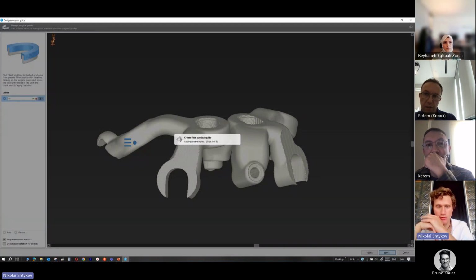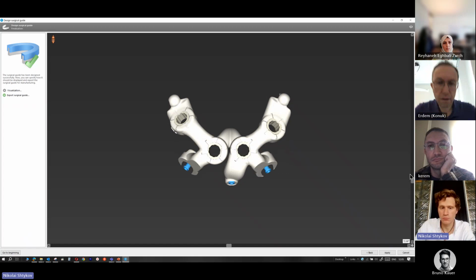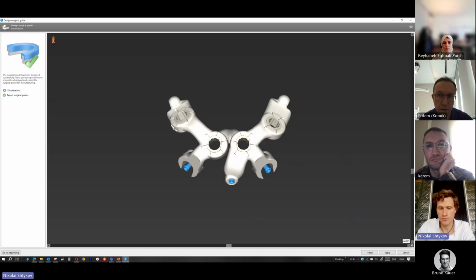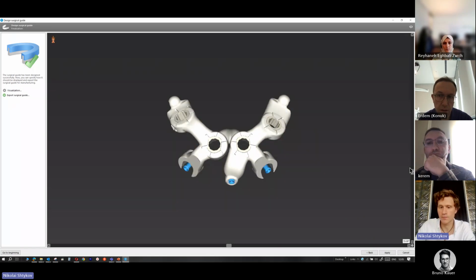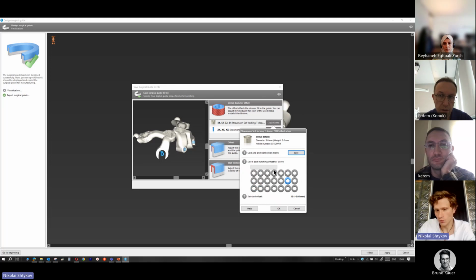I just show it for one. And here you can see surgical protocol, and you can add it for other implants. You can see the rotation markers, and of course before you start your printing, you need to choose a different offset for the sleeves.